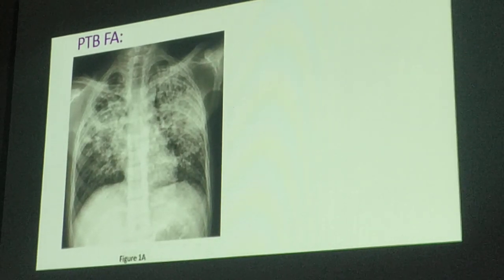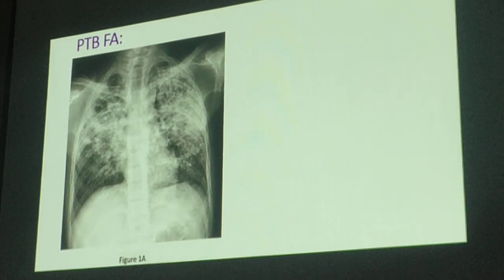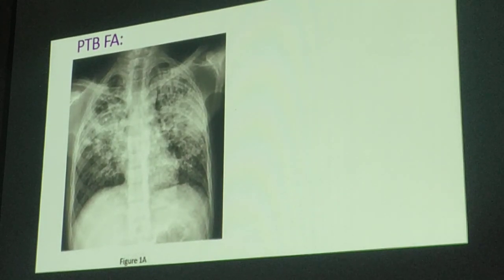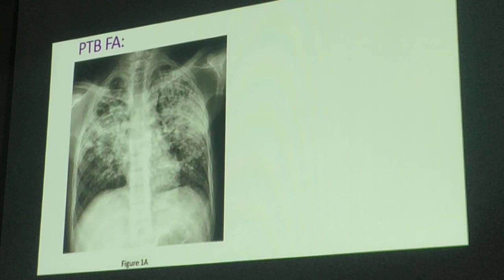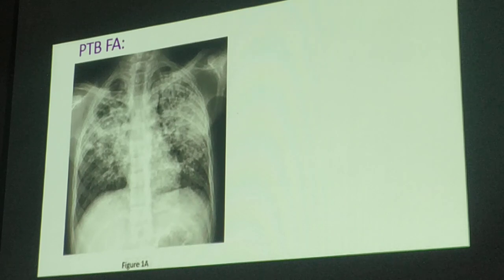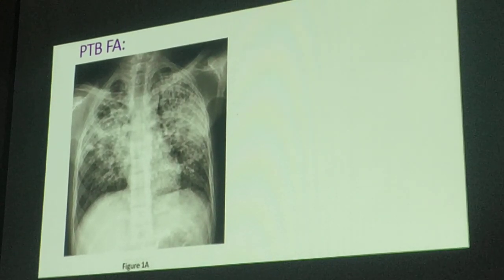This one. This is far advanced. Kasi if you try to move the volume of your infiltrates on the left lung to the right lung, it would almost fill the right lung field. Okay? Almost. Okay? So this is PTB far advanced.